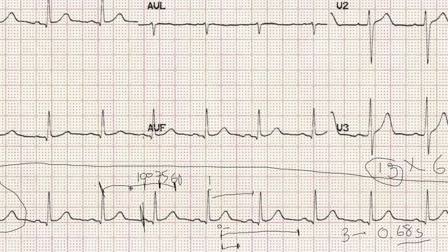And this is where it becomes that arbitrary divide between normal rate and tachycardia. And then 2 boxes, that's 150. 1 box, which is 300. Now you laugh at me and say, a rate of 300, that's impossible. But we might actually look at that once we venture into arrhythmias, which will be in a later episode.